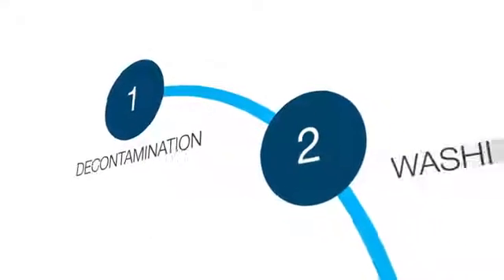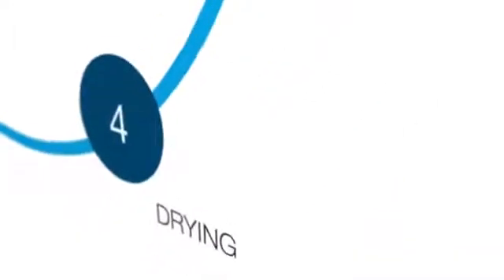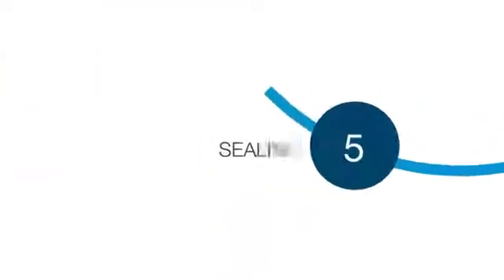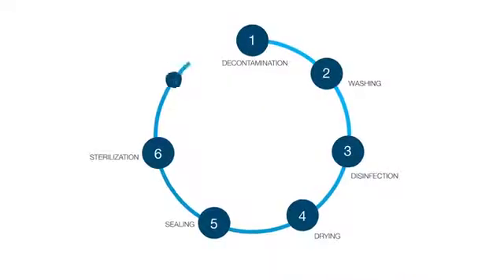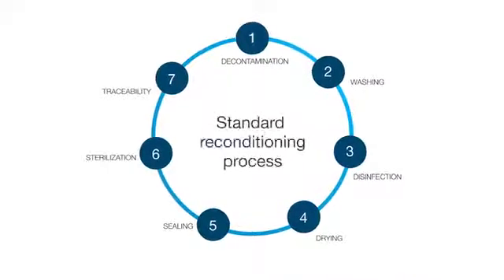These are the steps involved in the reconditioning process. Each step takes time, and each step involves certain risks. Each of these is an essential step in the reconditioning process. We will now examine each step of the process.